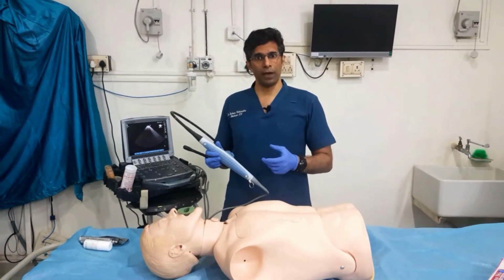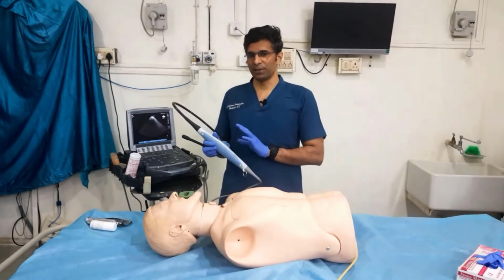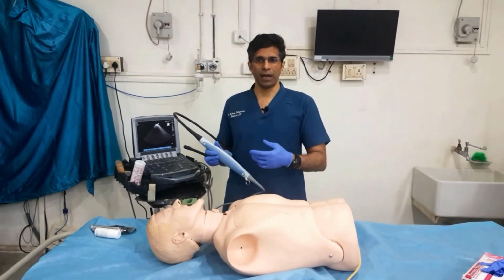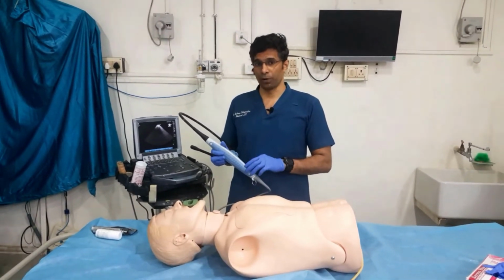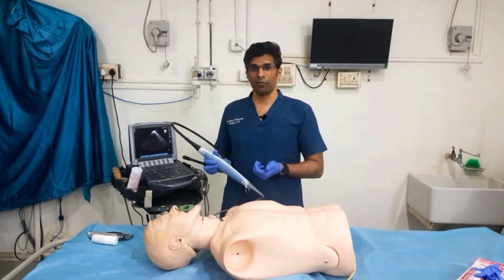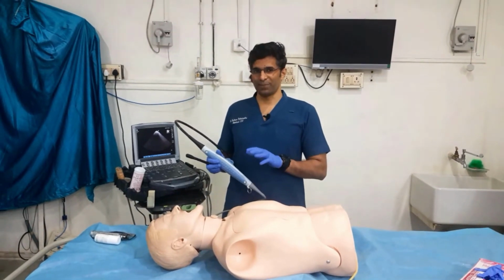The other situation is when you need continuous monitoring. The advantage of the transesophageal probe is that you can leave it in place and keep looking at the image as you intervene to see how changes happen. You can also use the transesophageal probe during cardiac arrest to identify the cause of the arrest as well as to look at efficiency of CPR. And you can do this without interrupting CPR.